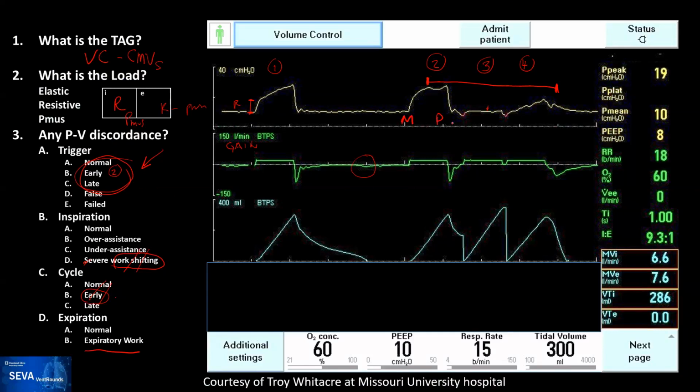And I know that in some of the literature we are calling this a reverse trigger, but I would say that there could be many causes out there, and it could be that the patient woke up or yawned or had a deep breath because somebody squeezed his finger. I don't know. It's not necessarily the same pathogenesis as any reverse trigger, but it could be. This is just one screenshot that you're seeing right now.